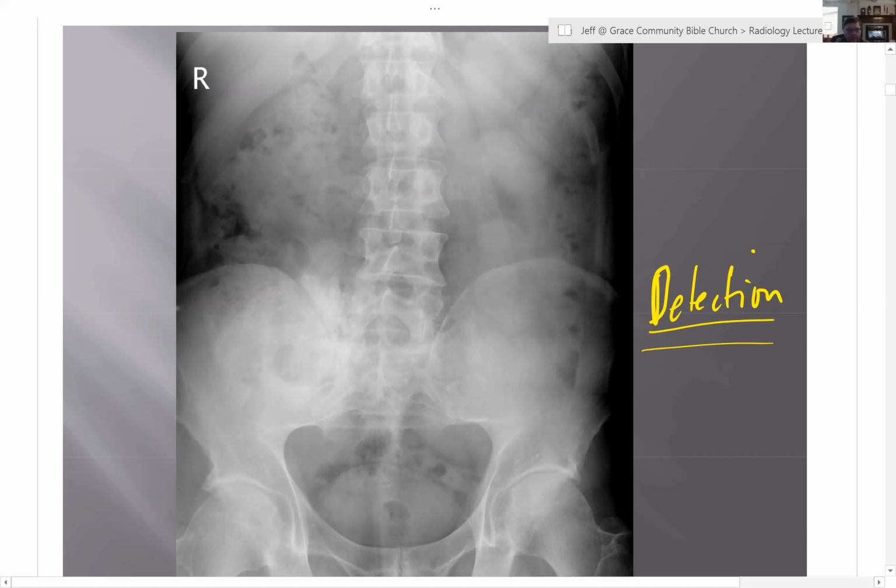Need a lateral view. Okay. I don't have a lateral view that I saved for you, and it didn't help a lot, but very good. You got it. If you're going to detect this stuff, especially in the soft tissues, you need a lateral view. So let's just go on. Let's just work with this one view just for fun. What do you think? Bone, joint, soft tissue, everywhere.